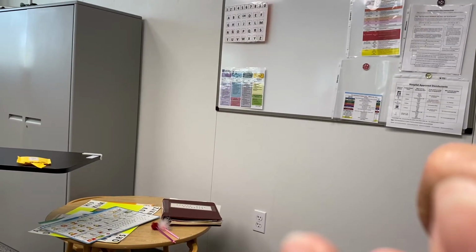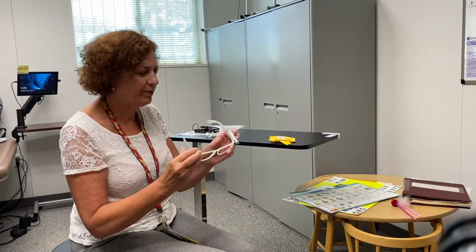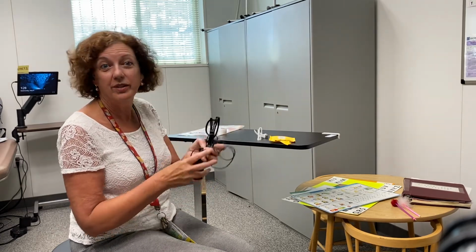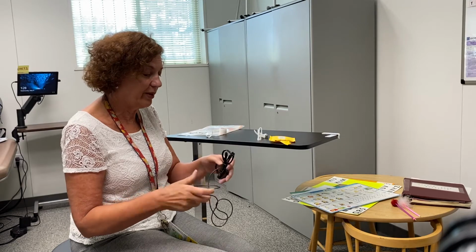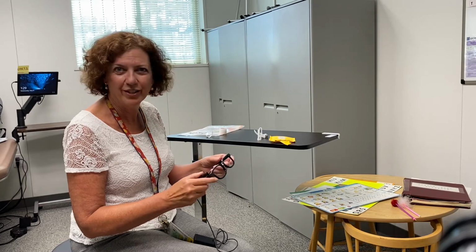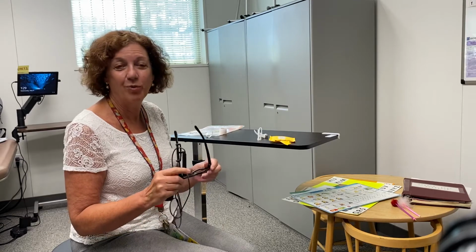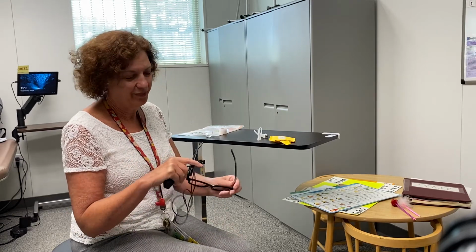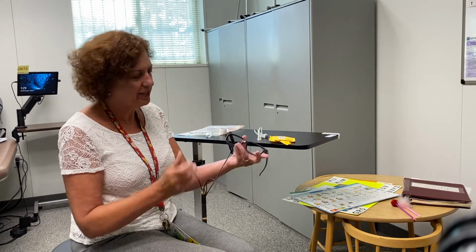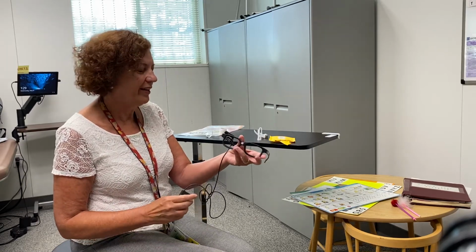So that's a very easy thing to use. There's a great little show, I'm not sure if it's still on, it was a TV show, about a young man with cerebral palsy who used such a device. In the show they talked about why he used such a low-tech system versus high-tech. I think he borrows his friend's Tobii Dynavox device, and it needed a lot of support, and he found this was something he could use with pretty low setup. But this was the device that he used. I can't remember the name of the show, but I'll find out.